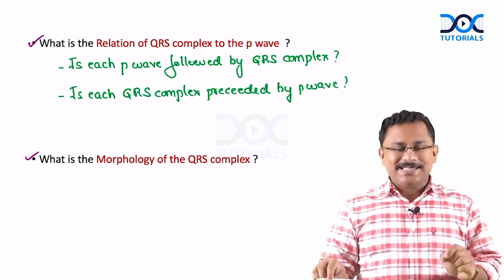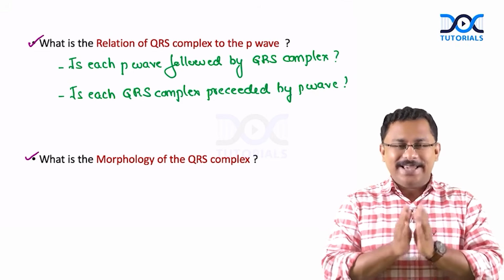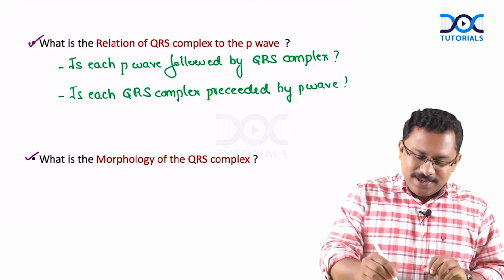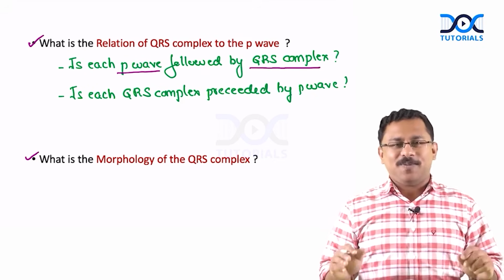Now, sub-questions, both of them, do they look the same? Well, they are not the same. They are two different questions. I'll try to explain that with examples. Let's take the first sub-question. Is each P wave followed by QRS complex?